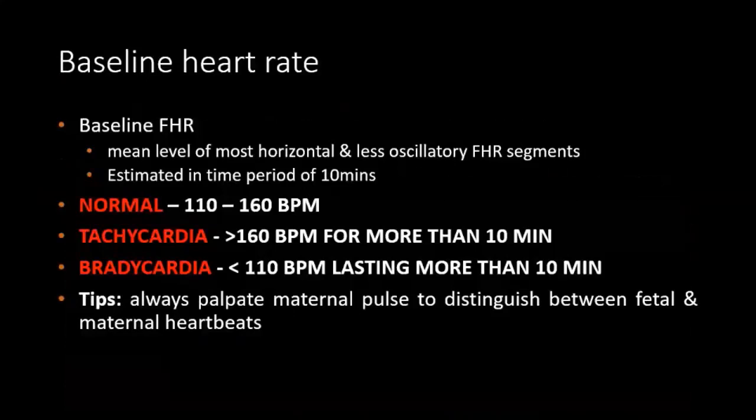Next is your baseline heart rate. Baseline heart rate is the mean level of the most horizontal and less oscillatory fetal heart rate segment, and it is estimated over a period of 10 minutes. I will show you what I mean in a while. The normal fetal heart rate baseline is 110 to 160. Tachycardia is when it is more than 160. Bradycardia is when it is less than 110.